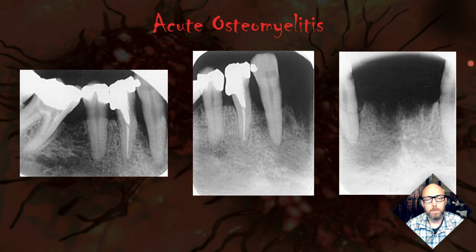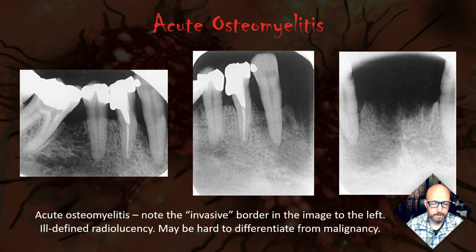So pretty rare. In most cases of osteomyelitis, you're going to see a mixture of acute and chronic, where you have a mix of radiopaque and radiolucent lesions. Remember, sequestra are the hallmark of osteomyelitis. So if you see sequestrum, if you see periosteal reaction, those are certain things that should lead you toward osteomyelitis first on the differential. And so this is just a case of a very aggressive acute osteomyelitis.